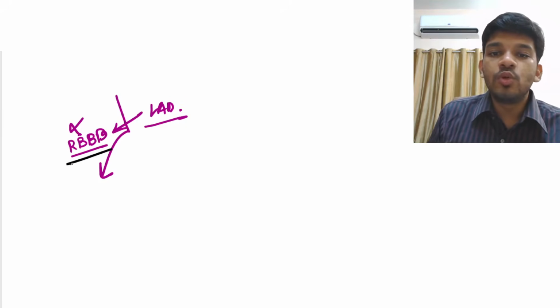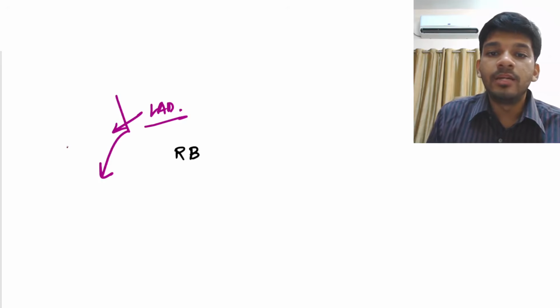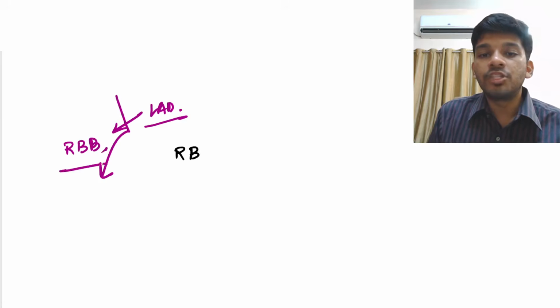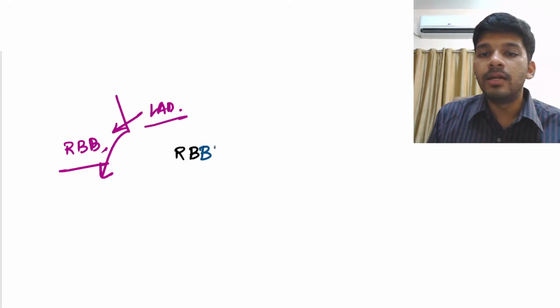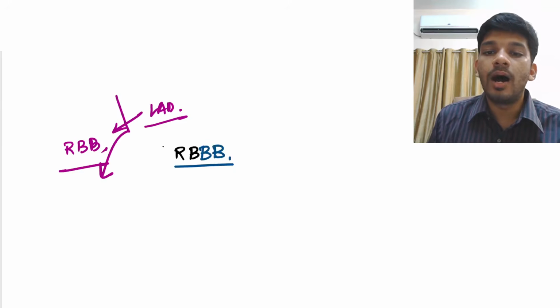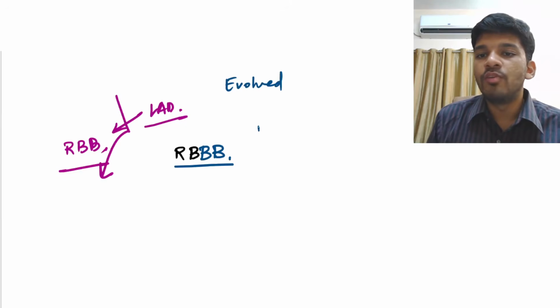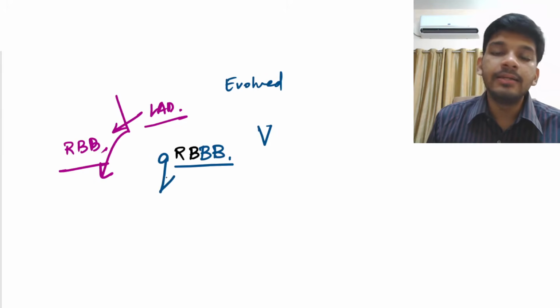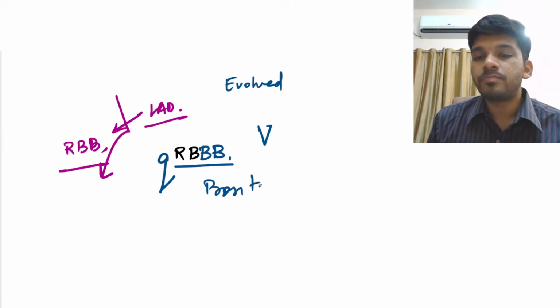In fact, because of this, if your right bundle branch is getting affected as a conduction abnormality, you will see on your 12 lead ECG a right bundle branch block, RBBB. Remember that in the evolved phase of MI, you get Q waves. Q waves represent an evolved MI. So a QRBBB pattern represents an occlusion that is proximal to S1.